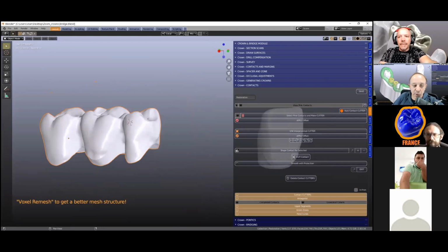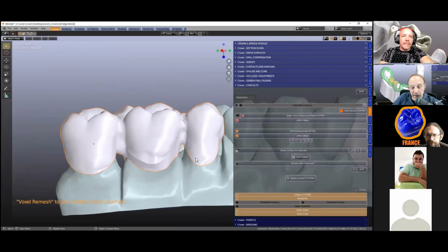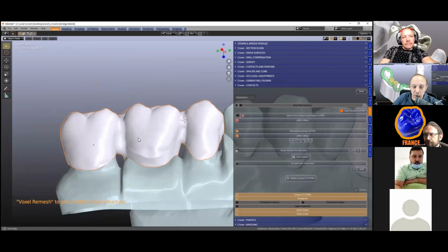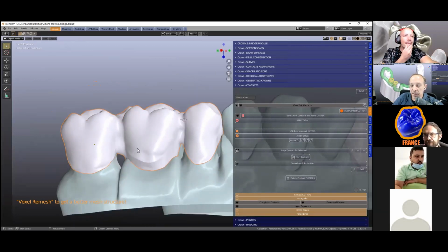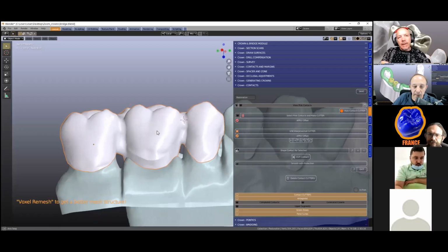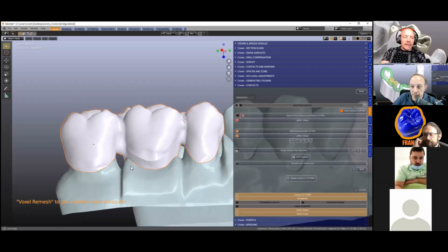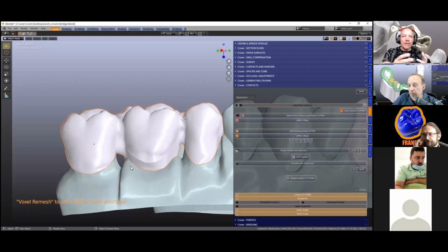And Michael, that's a good point that Baptista mentioned, to get an interproximal brush under there. Is there a sculpt tool that you can think of that would create a wedge, not a crease, of a certain measurement? Look, Wolf, maybe a crease would be good. I think if you would put something in there that you could see through, then we could perhaps sculpt through it, just like I've got the contact cutter. Do you know what I mean? We could maybe have an interproximal contact cutter. Maybe you can introduce a horizontal cylindrical shape, and we just go through there, and we can adapt very nicely.